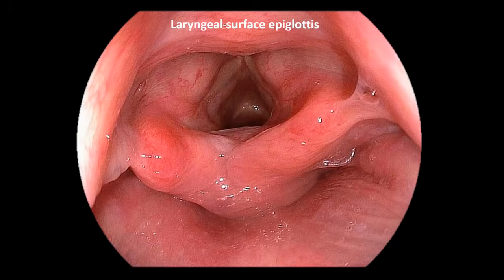And the epiglottis, when we swallow, tilts inferiorly to close the laryngeal inlet, so we don't aspirate, and no food or drinks enter the larynx. Anyways, enough of that. This is the laryngeal surface of the epiglottis, and here in the depth we can see the vocal cords, and the part located underneath it is called the subglottis, also visible here.